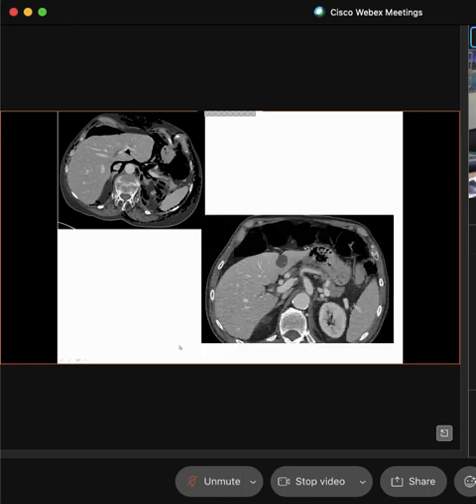But if I went back and I looked, here is my vertebrae. And we see less liver than we did here. You see this? Less liver than we see here. Which one lies more inferiorly? Image number 1 or image number 2, Sharon? It will be image 2, more inferior. More inferior. Beautiful. So we see more liver, less liver. Less liver, more inferior. Make sense?